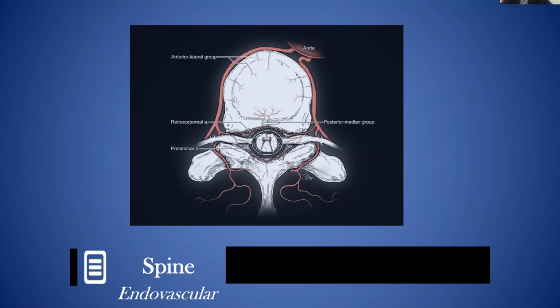angiography. I'm sure you guys know what angiography is. We use fluoroscopy, which is sort of X-ray movie.